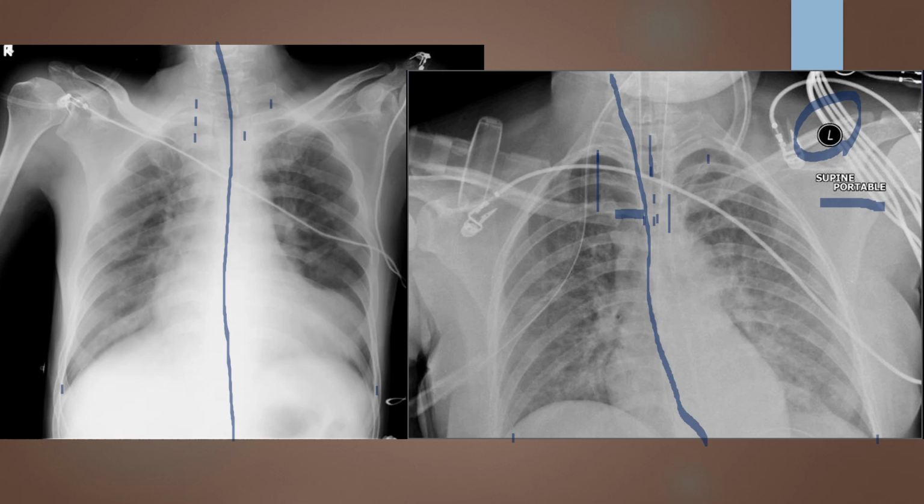So ultimately, I'd have to make the final decision based off of that clipped anatomy. If I felt like it was just for ET tube placement, I would probably proceed with this exam. If it was for a regular evaluation, then I would need to repeat it based upon clipped anatomy.